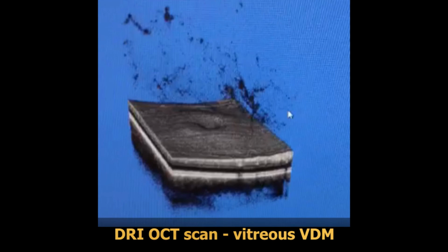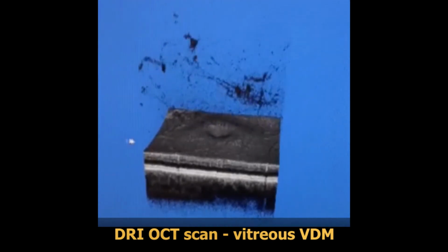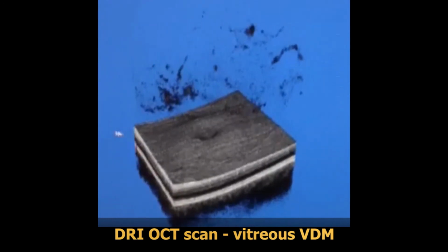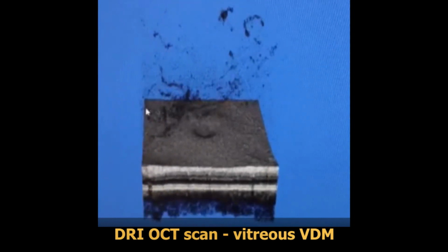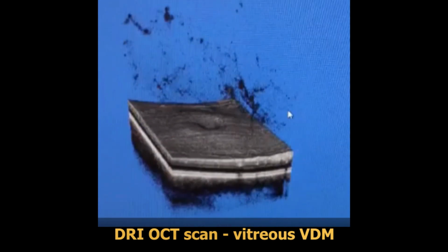Furthermore, a need for quantification exists because in order for us to be able to gauge the severity of disease, at least on the basis of vitreous structure, it would be very useful to measure the number and size and distribution of these opacities to get a better understanding of what's going on inside the vitreous bodies of patients afflicted with vitreous floaters.